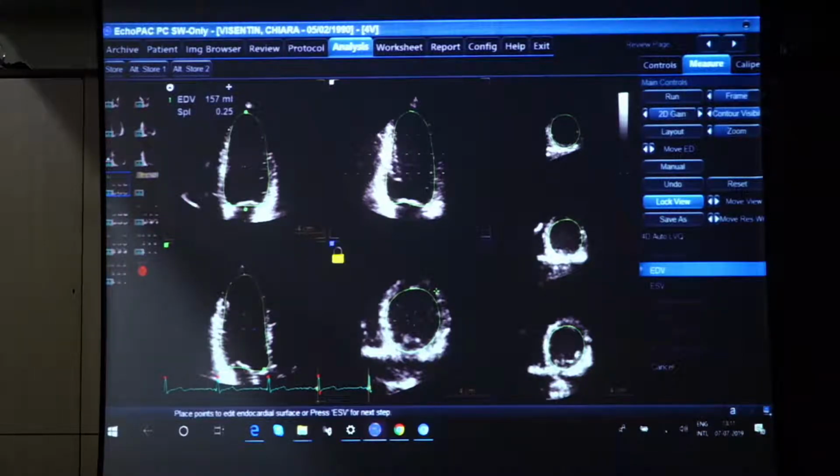For example, here you see that we have some black spots between the automatically identified endocardium and where I would like to have the true endocardium. I put the green cross there, and then I simply click with the left button of my mouse, and immediately the shape is re-edited for the entire contour.